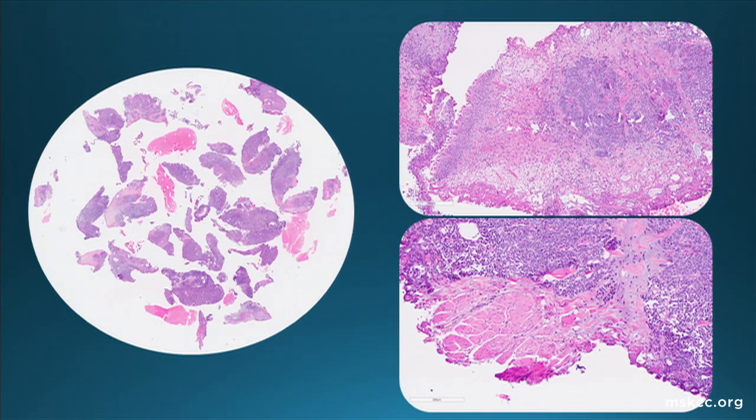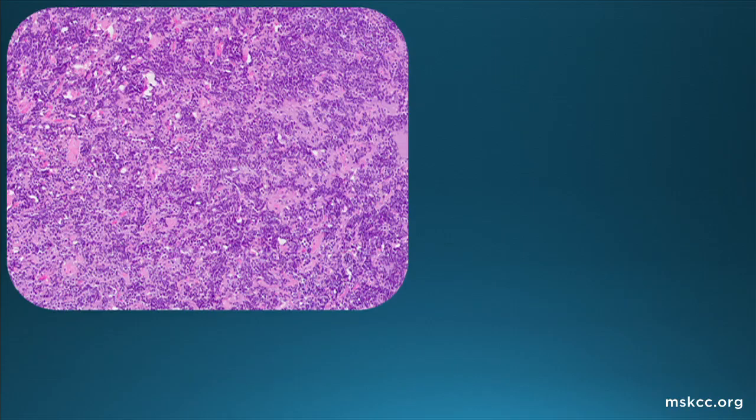And on the top right, we can see the lesional tissue within the right-hand side of the diagram, adjacent or underlying pretty normal appearing urothelium. If we get an arrow up here, a pretty normal appearing urothelium with some reactive umbrella cells. And here on the bottom image, we see a medium-sized detrusor muscle bundle, pT2, muscularis propria invasion.